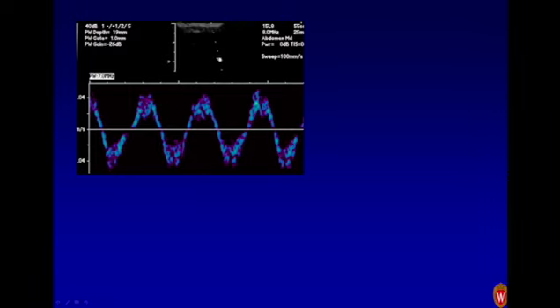So everything here is moving at the same velocity. Here I hit one wall, I'm going to one side, and then I'm going to slow down. I hit the other wall, start going in the other direction, and so I'm creating this artifactual tracing. This is just me moving the transducer across the gel, and I'm just doing it steadily.